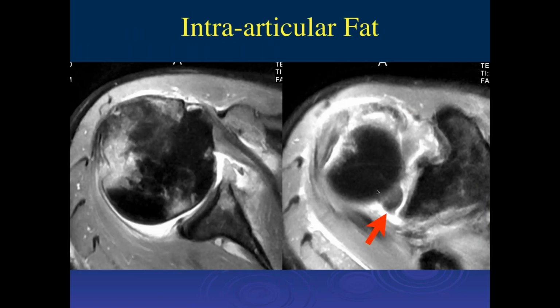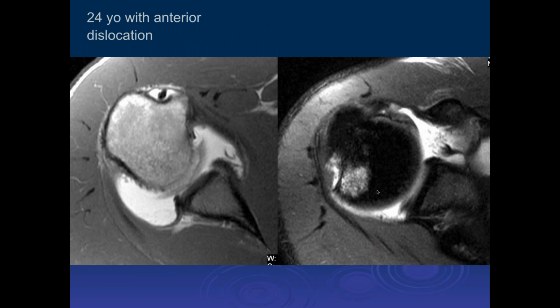Okay. So what do you think here? So actually, let me just show that there's a Hill-Sachs deformity with edema. Hill-Sachs with acute edema. Yeah, and anterior labral fracture, or possibly a labral, like a Perthes lesion or something.